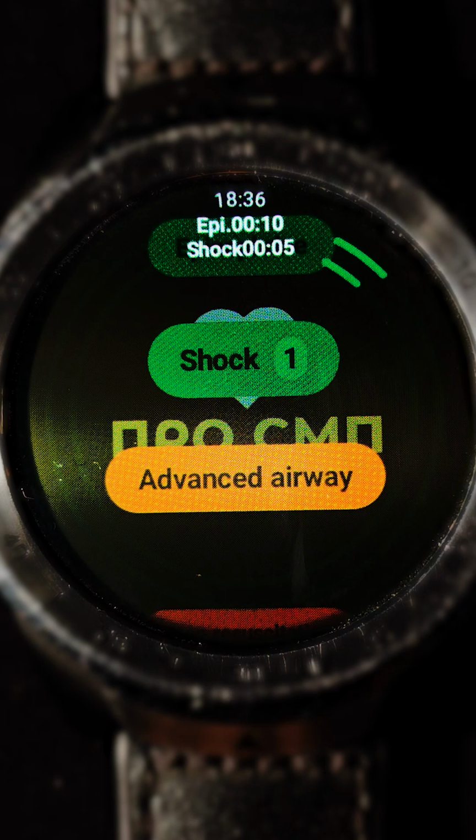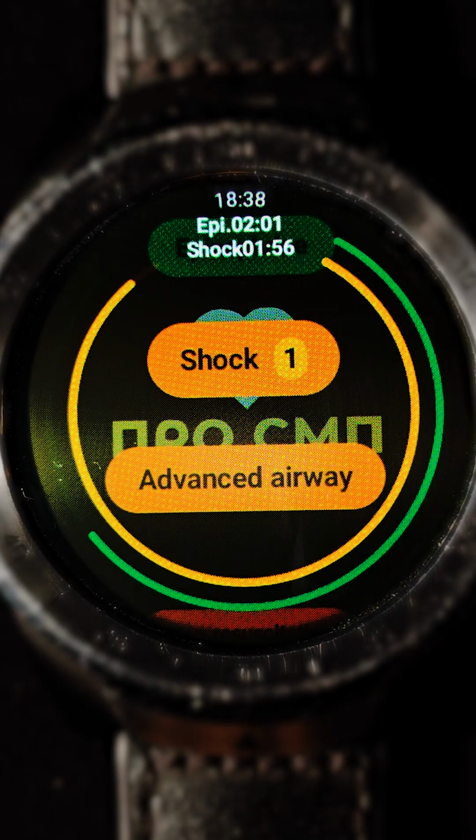Under this button is the defibrillation button with a press counter. It will start the second timer and take over the rhythm assessment timer. After 1.5 minutes, the application will notify you to prepare for heart rhythm assessment and charge the defibrillator for the next shock. After 2 minutes, it will remind you about rhythm assessment and performing defibrillation if necessary.